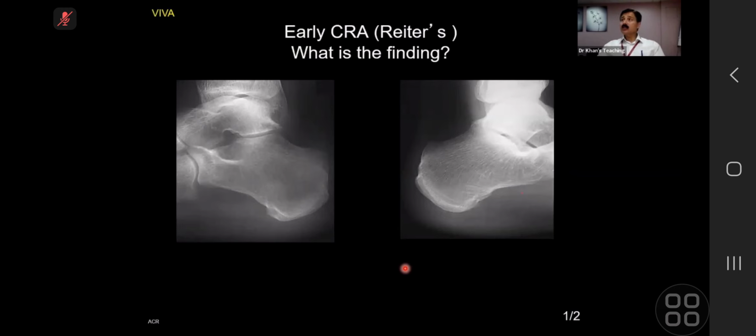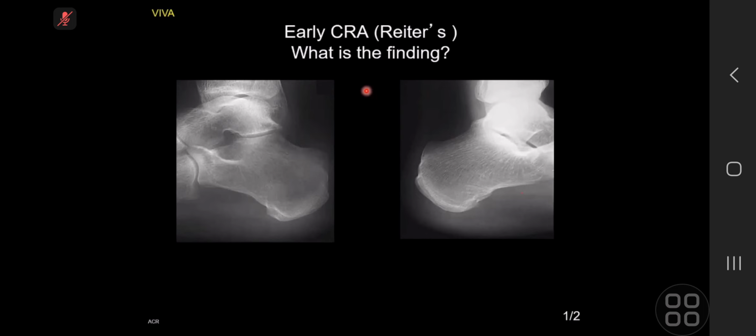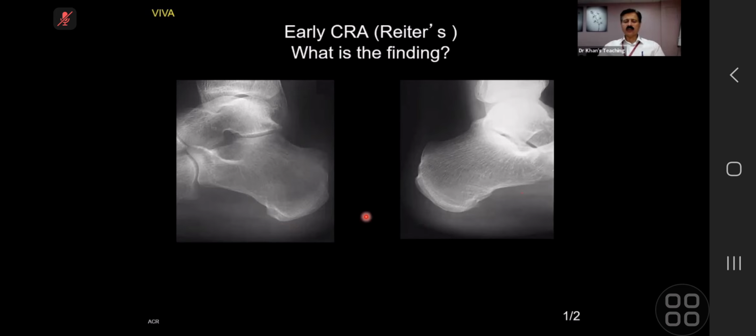Okay. Candidate number 5, can you raise your hand, please? Candidate 5, can you hear me, please? Yes. Okay, I have given you, this is one side, this is the other side. It's a very important exam film, very subtle findings. So can you take over? What are the findings and which side is abnormal?